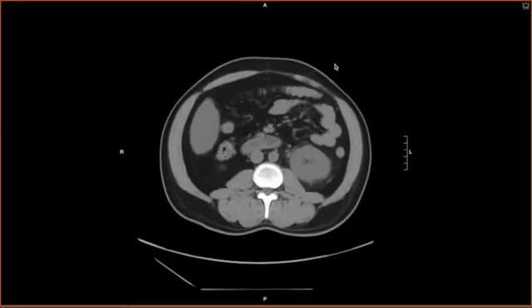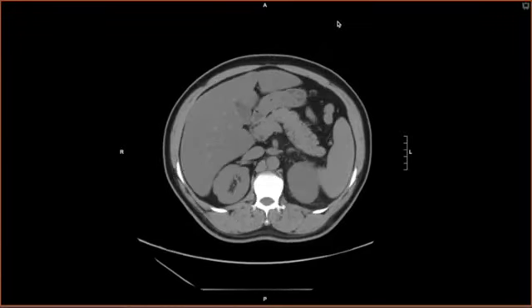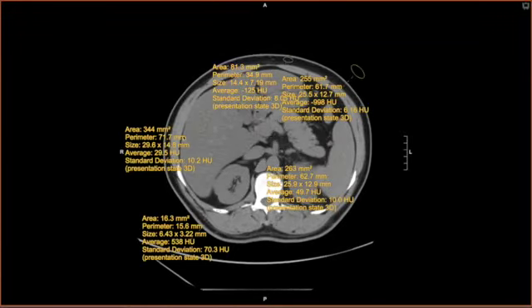And the soft tissues that we've selected up here are the liver and the spleen. So the liver here measures an average density in that area of 29 Hounsfield units, and the spleen here measures an average of 50. Okay, and then we have selected a rib here, where we've selected a little bit of cortical bone, but also some of the bone within, and it's a lot higher number. So the Hounsfield unit, or the density here, is 538 Hounsfield units.